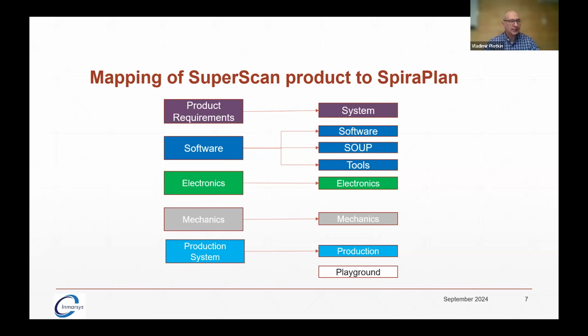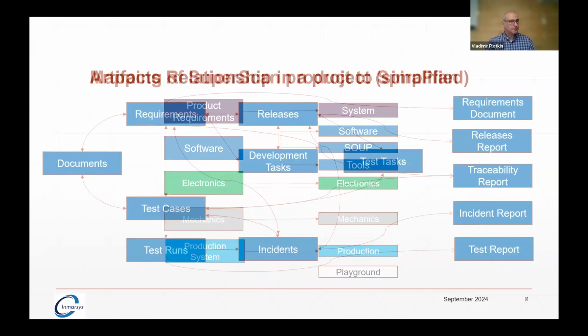Because you really don't want some newcomer coming to your software project and start playing, amending your test cases because they just don't know where to press. So you really don't want that. And that Playground is a useful thing to have. Also some test people tend to use Playground for exploratory testing when they're just trying to figure out how to do something within the system, within the software.